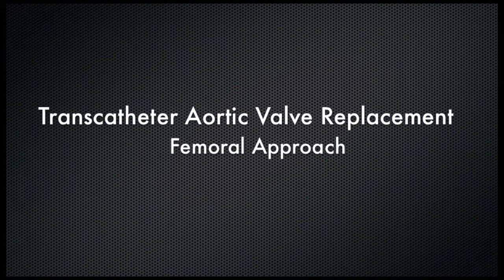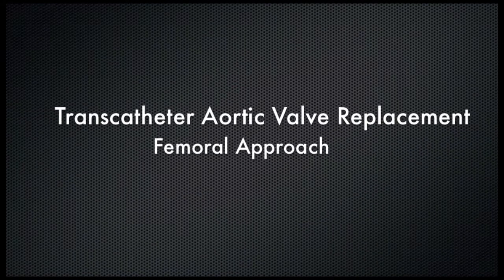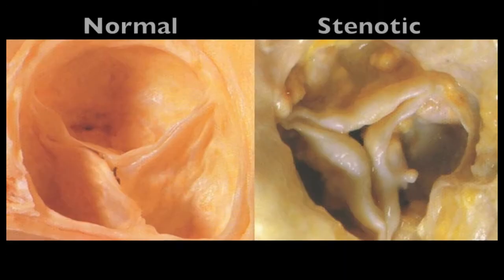This video is designed to provide a patient's introduction to transcatheter aortic valve replacement, specifically by the femoral arterial approach. These are aortic valves. The one on the left is normal, the one on the right is stenotic, and you can appreciate how thickened and calcified the stenotic valve is.